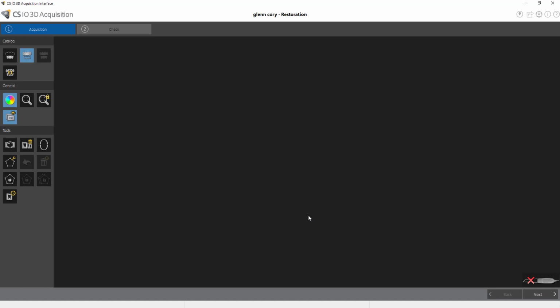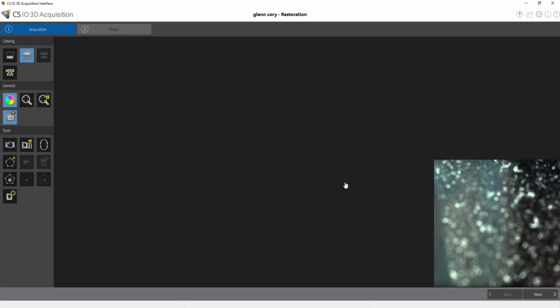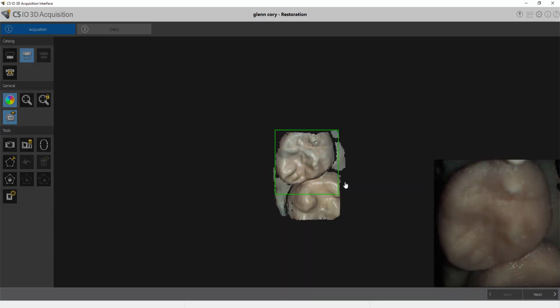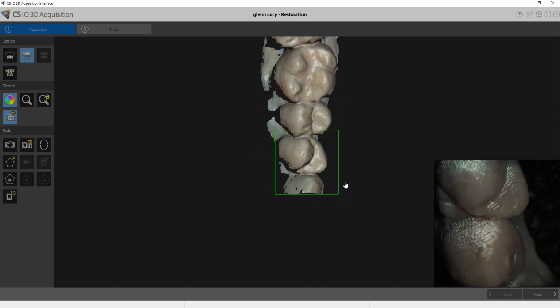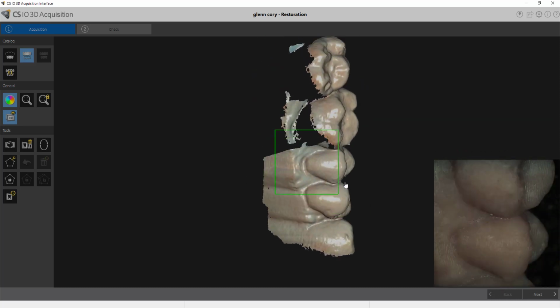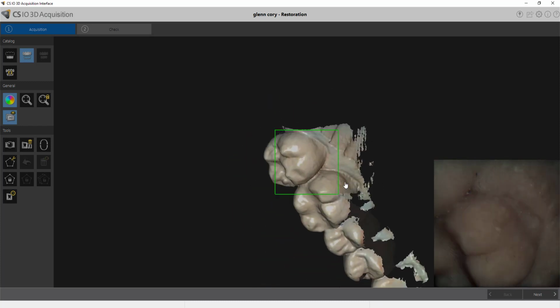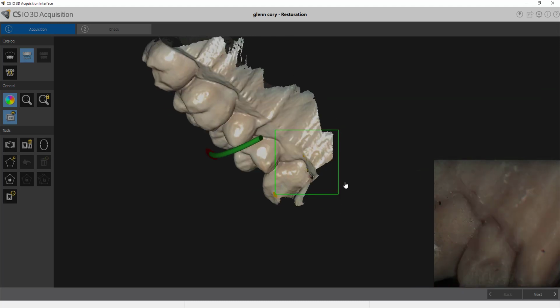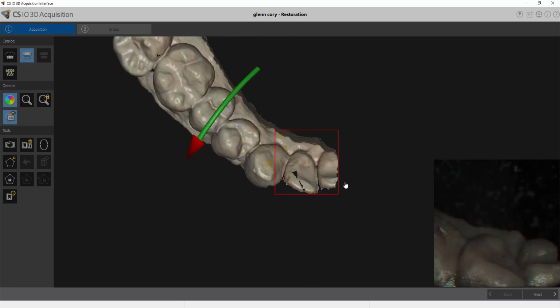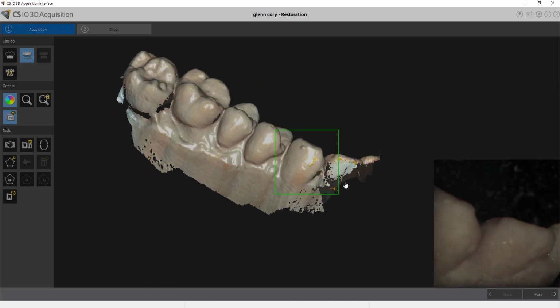there's simply a pay per click, or an export fee per case that you design, for things like surgical guides, ortho aligners, dentures, and so forth. However, the difference with this Crown and Bridge module is that we've decided to just make it entirely free, so you can use this to make all the crowns, bridges, wax ups, implant restorations, make all of those things at no charge whatsoever. There's not an export fee of any kind on this, so it's a really big value added thing that Blue Sky has done.